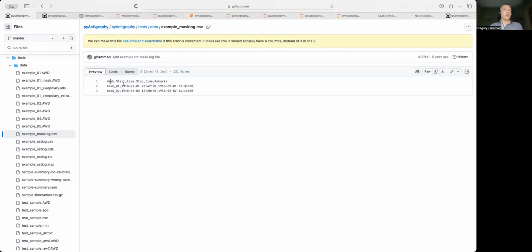And then for the start time, please use the standardized time, because especially if you exchange data worldwide, we don't have the same convention to report a year, month and day, and that's always the ambiguity. Is it the 1st of February or the 2nd of January? So just use the standardized way, which is year, month, and day, and then the time. That will save you from issues, especially if you exchange files.